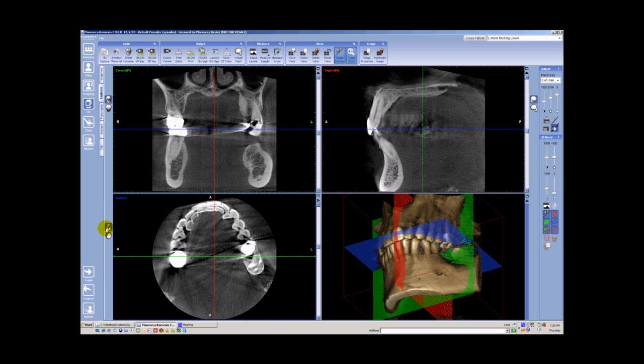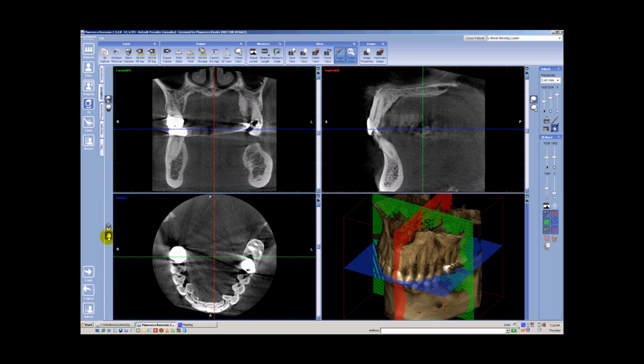Axial view, by default, the patient is in the supine position, facing upwards, with the doctor standing with the view from the foot up. If you wanted the view from the head down, you could select that orientation.